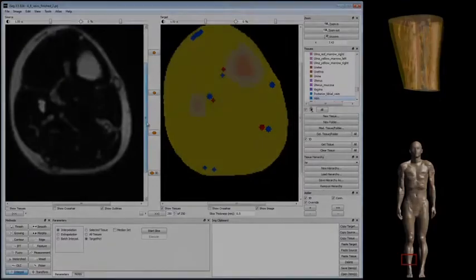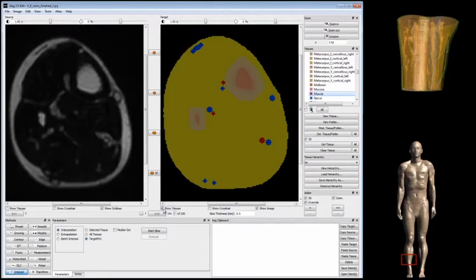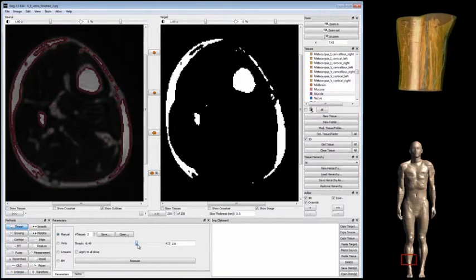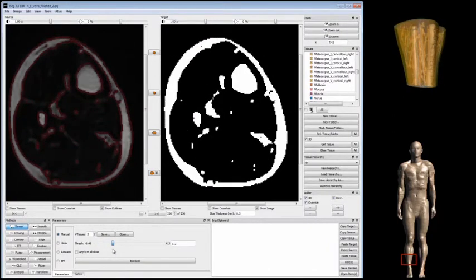The final step is to segment the muscles. The muscle tissue is segmented semi-automatically by thresholding. Here it is important to define an adequate threshold level. iSeg comes with a variety of semi-automatic and automatic thresholding techniques. For the muscle, we chose the threshold manually with the help of the slider. After the adequate thresholding level is found, click on the adder depicted by the plus on the right side, and assign the black parts inside the body to muscle.